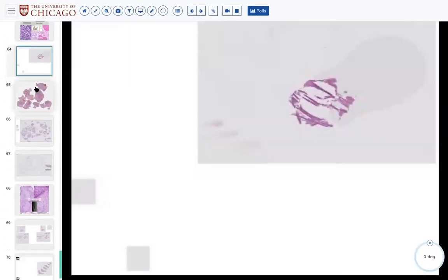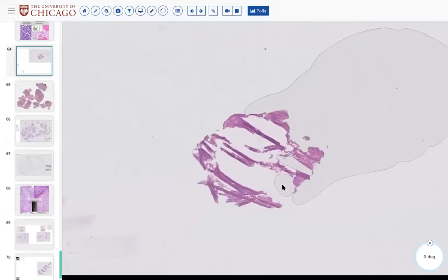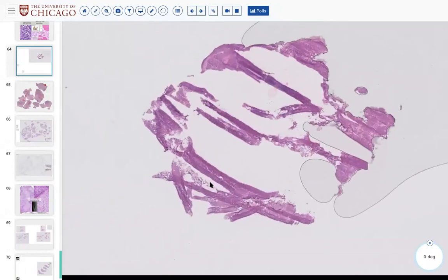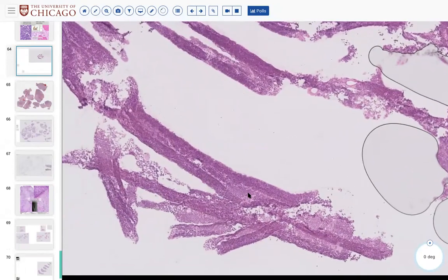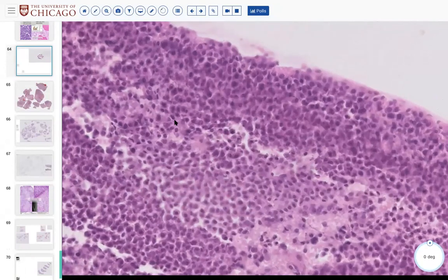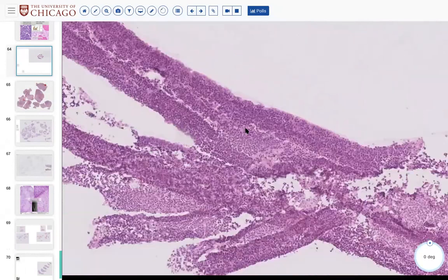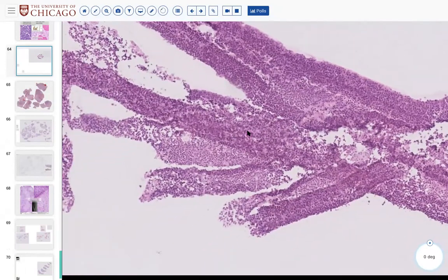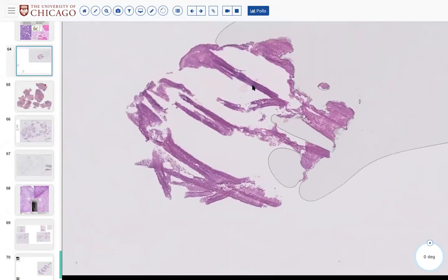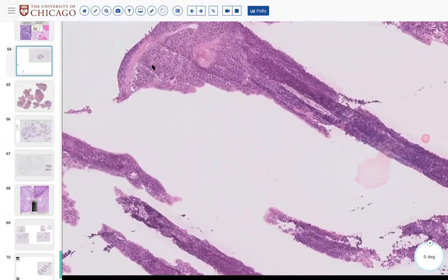Before I go there, I'm going to try to show you the next thing that you might see in adults. You haven't seen this one. This was a frozen that some of you might have seen, because it was one of the frozens we had on our Leica validation. Sometimes the cutting is imperfect, right? So we have some chatter artifact with these shards and strands of cells. But let's look between the shards and strands of cells.